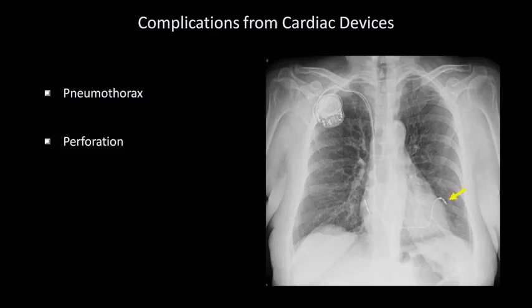This rare complication typically causes immediate life-threatening tamponade, in which the blood from the heart begins to leak into the pericardial space. Amazingly, for some reason, the patient in this example film seems to have escaped this problem, at least temporarily. However, there will definitely need to be a cardiothoracic surgeon involved in this lead's removal.